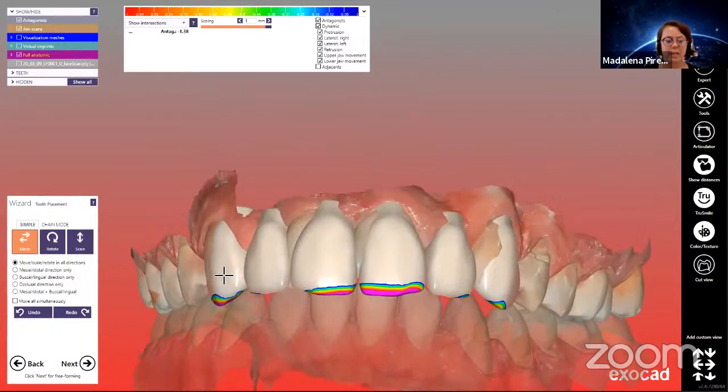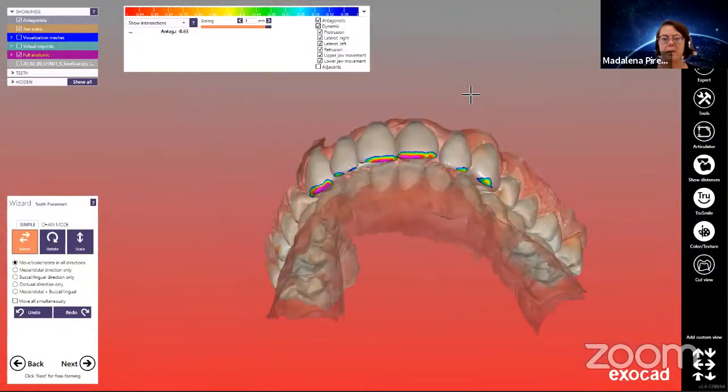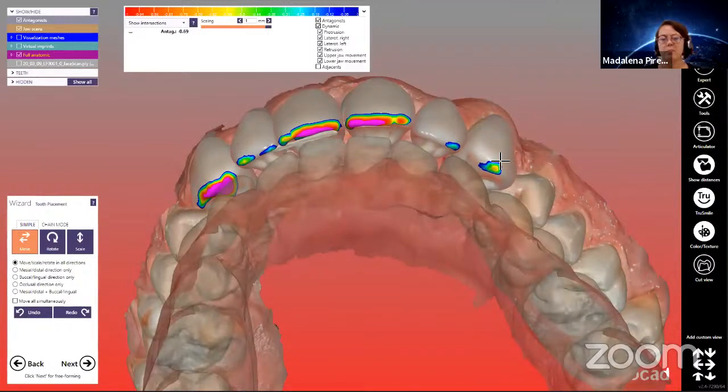Let's position teeth. In this patient here, we could, for example, recreate the canine guidance if the doctor wishes so, of course, and if it's prescribed, if this is going to help the patient relieve pain, etc. As you can see, as I move the teeth, the colors change.